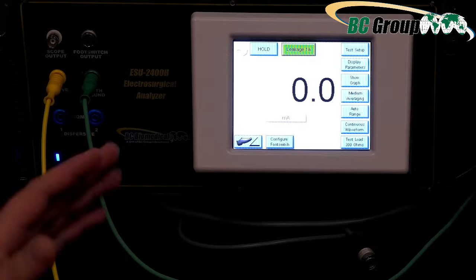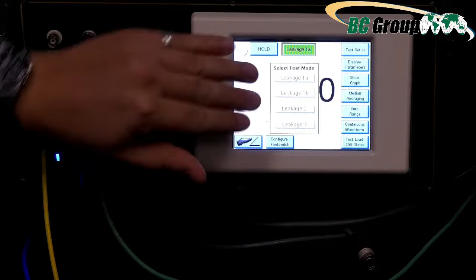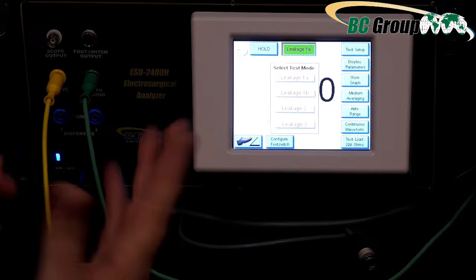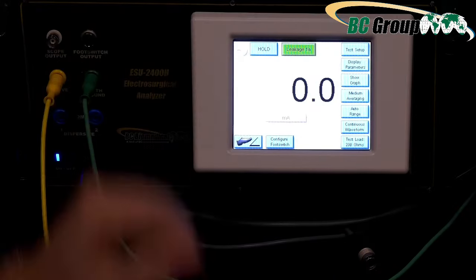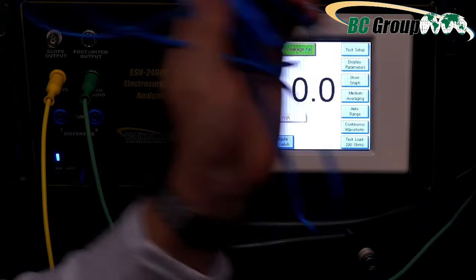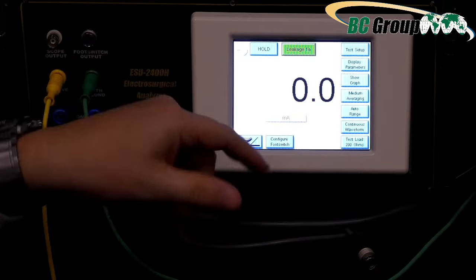And here is where a lot of people are just lost. So we have 4 different modes for RF leakage. Mode 1 is when you have no return electrode, and they're saying what would happen if the device is activated or hot and you don't have this electrode. They want to make sure that the doctors and patients are not part of the path.